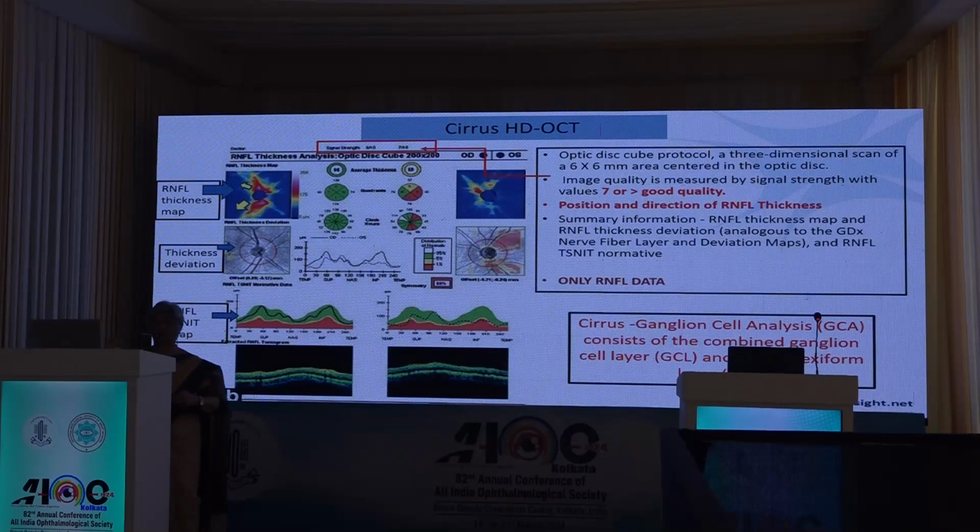So now please let's have a look at the topmost thing. In the topmost one, this is the only image you get where a statistical analysis is not taking place. It's the actual image of the patient's optic nerve with the retinal nerve fibers. Now, if you look at what is hot, red is hot. Yellow is partially hot. What is not hot is blue, the sky blue. So therefore, we look at the hot colors.